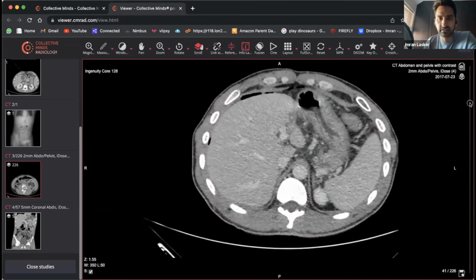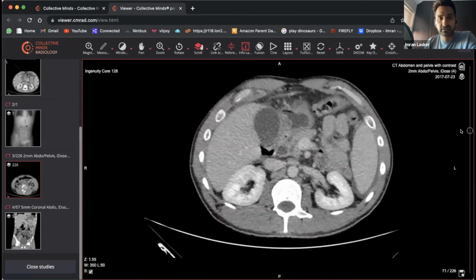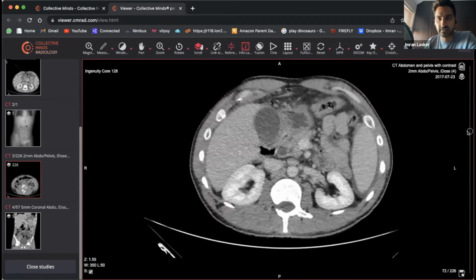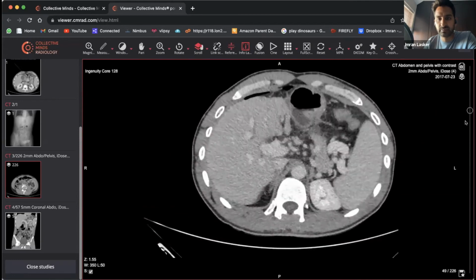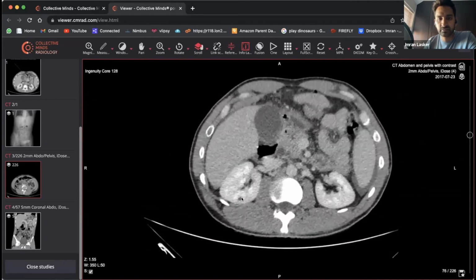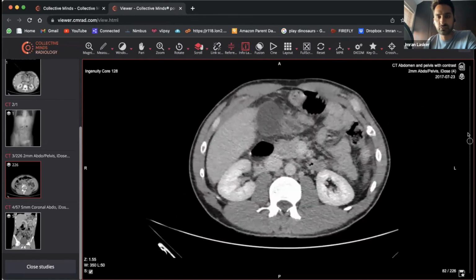So first of all, what phase of imaging? We've got the artery versus the portovenous system. The portovenous system looks slightly brighter, so this is a portovenous image. Scrolling through, the liver looks okay. The gallbladder looks all right, actually, doesn't it? And then we look at the kidneys, which are sitting here and here. Some of you may have spotted a simple cyst there, but actually there's not really much going on there at all. Everything looks pretty good.